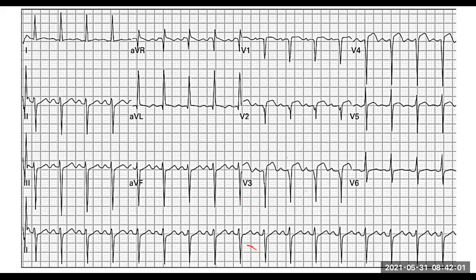You can even start telling the physician on call, let's say, listen, I've got this patient, it could be pericarditis, could be a myocardial infarct. So I've taken my enzymes, I've treated the patient as an infarct in the meantime, considering the age, the history that's happening. But at the same time, I've taken infective markers. I've done all of that to see if it could be a pericarditis as well.